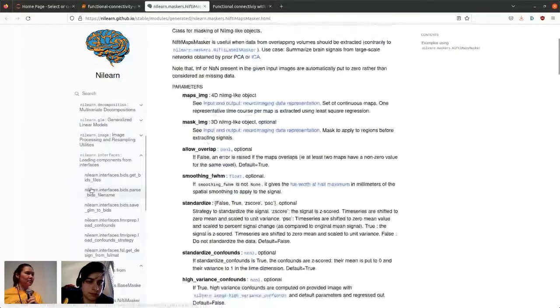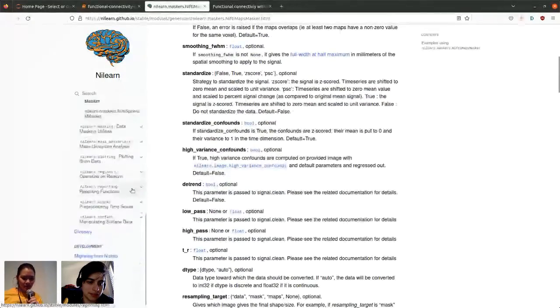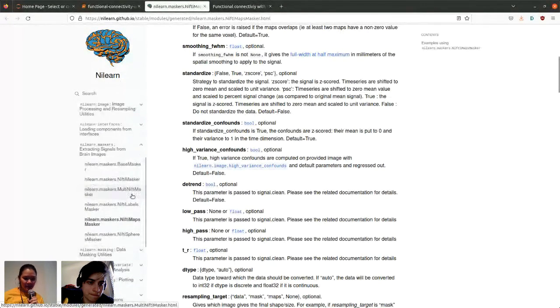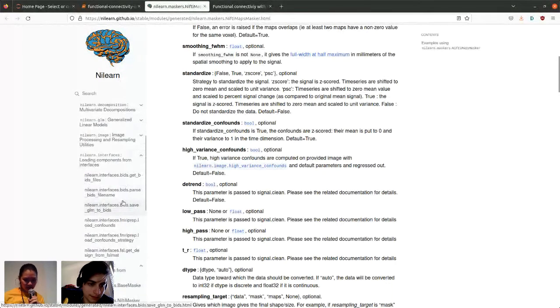Oh, whoops, wait. My scrolling is a bit off, so... You will need to find fMRIPrep. Oh, interface, sorry. There we go. Yeah. There we go. Yes.